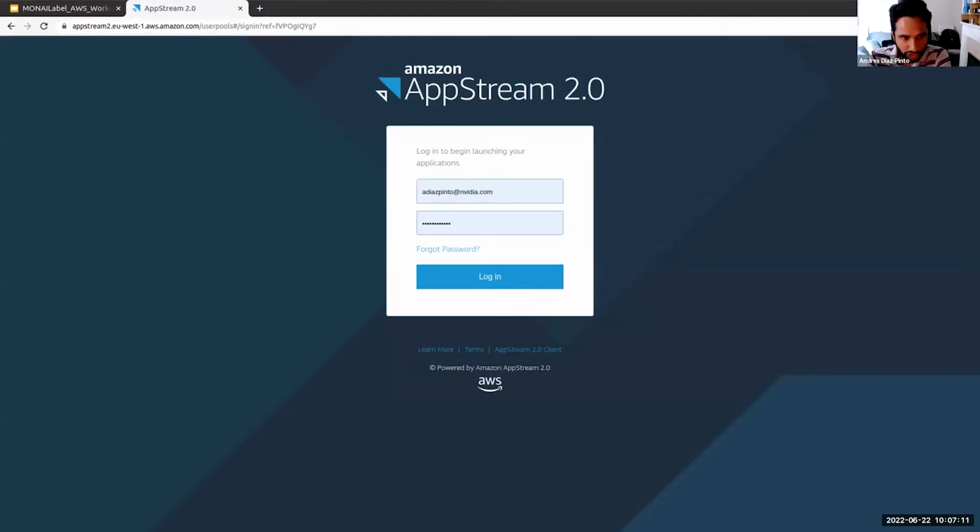Yes, very good question. So MONAI Label is specifically for segmentation. Okay. We don't do classification. Once you train the model, you can use MONAI, the main library, to do the classification. So MONAI Core allows you to do segmentation, registration, classification, anything. But MONAI Label is specifically created for segmentation. Okay. Multi-class, yes. So that's the demo that we're going to show. You can do multi-label, right? Multi-class segmentation, not multi-class classification. I don't know if that makes sense.